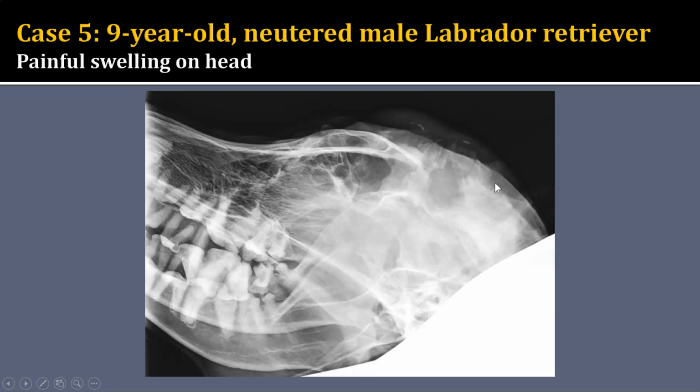The parietal bone itself appears thicker and maybe more sclerotic in some regions around that area of lysis. In fact, some of this is probably some thickening of the parietal bone almost into the area of the frontal sinus. And then additionally, I see this region of somewhat spiculated periosteal reaction, as well as maybe some amorphous periosteal reaction.